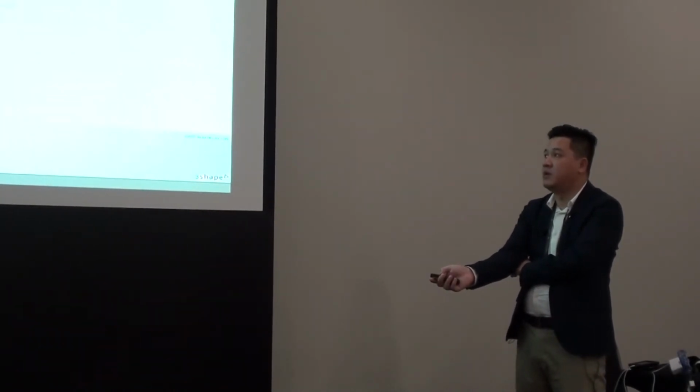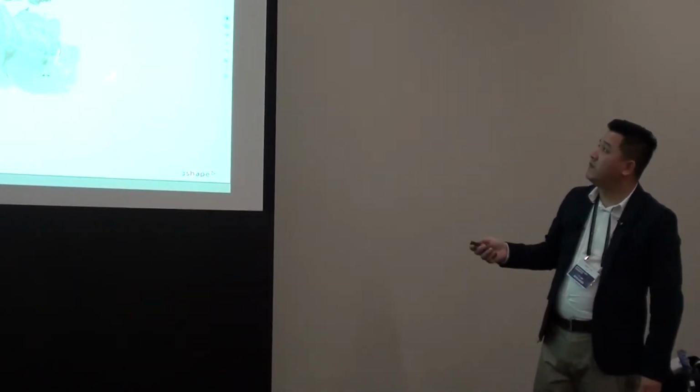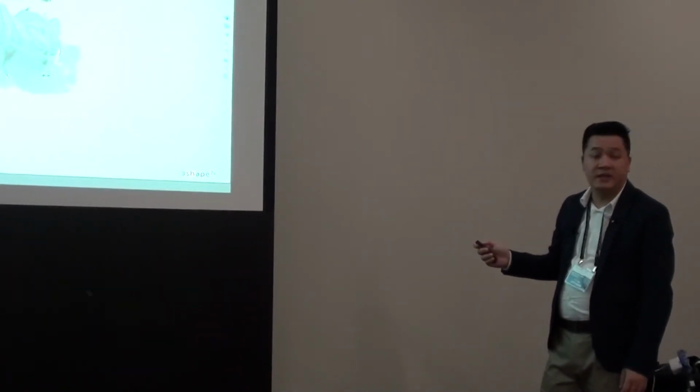Import the upper, import the lower. I'll skip past this. And then what we're going to do is import our pre-prep scans, or our final scans as well. And what we're going to focus on now is the additional scans tool.